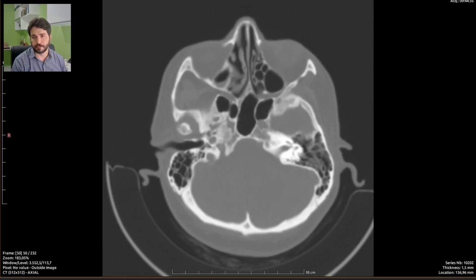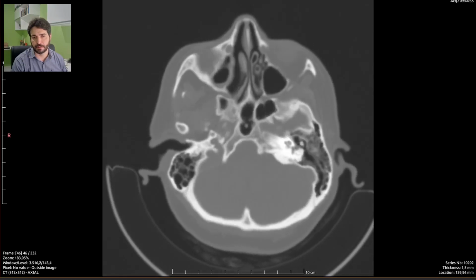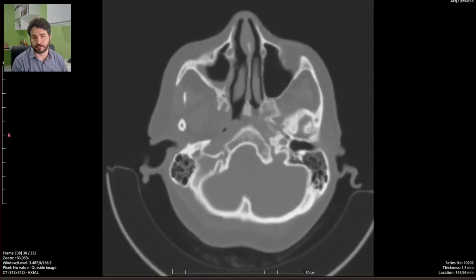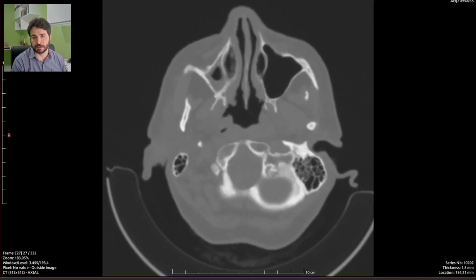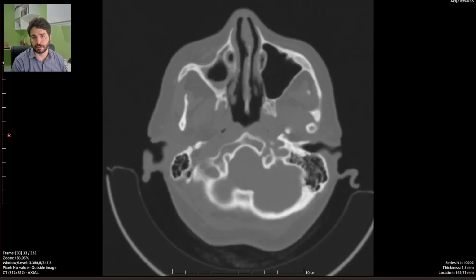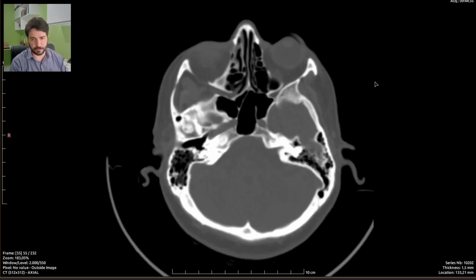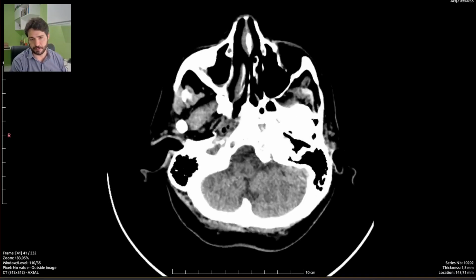There is arthrosis of the temporal mandibular joints, which I'm not going to report because this isn't an exam for that. Let's not distract ourselves away from the main purpose of this exam.